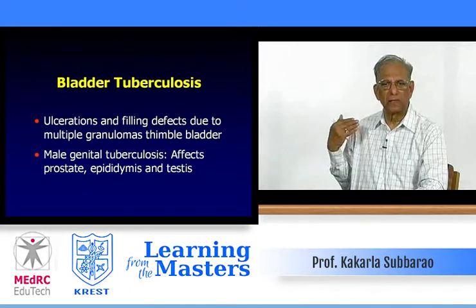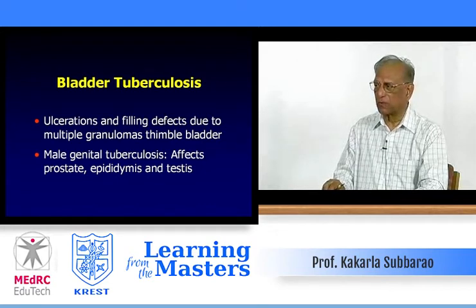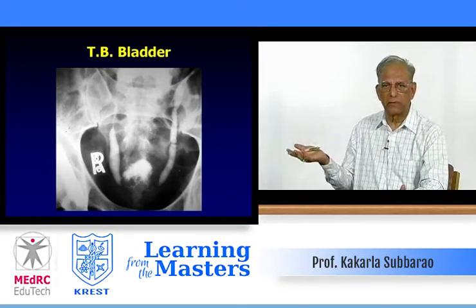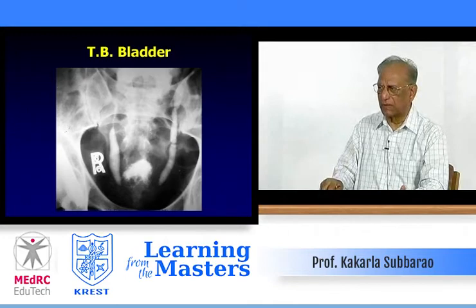You cannot say it is definitely tuberculosis unless you correlate with other findings involving other organs with tuberculosis. Again, to show a contracted bladder, the prostate impression is there, but it may be just normal enlargement of the prostate, and reflux into the ureters, which are mildly dilated.